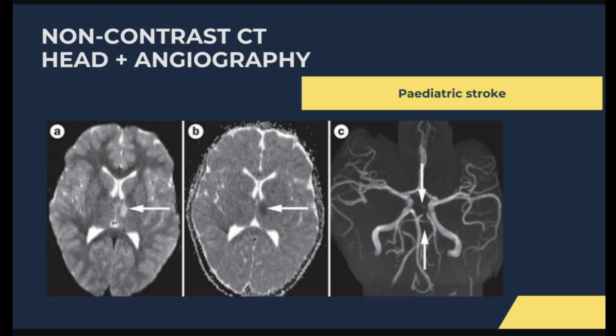Thank you. And thank you for the correction. Yes, I just forgot we were trying to find a CT, but an MRI was so much better. And I think that usually happens with brain imaging in children as well, that acutely you would do a CT, but then a bit later or a few days later, an MRI shows the difference much better.